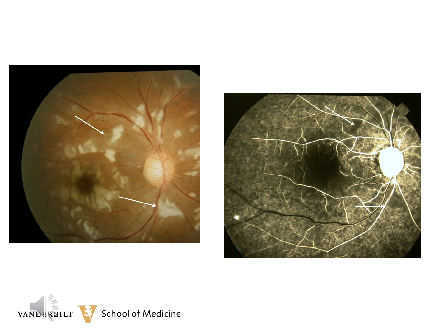Cottonwool spots are caused when capillaries in the retinal nerve fiber layer are blocked. The nerve fiber layer will become edematous and it will look white. The hypofluorescence in this situation is not as dark as that caused by blood. In fact, the hypofluorescence is most likely a combined effect of a retinal filling defect as well as blockage from the retinal edema. On this angiogram, you can see delayed filling of the inferotemporal retinal vein as well.